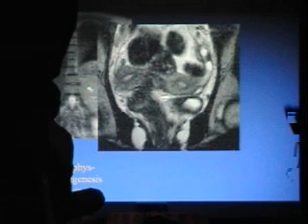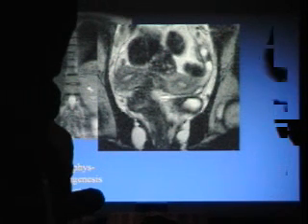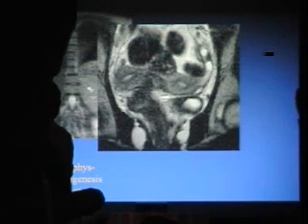see another one here. These particular cases really need a lot of images, so a little bit hard sometimes to show in a session like this, but you need to use all your images to make sure you look carefully for this classic appearance of a uterine horn.